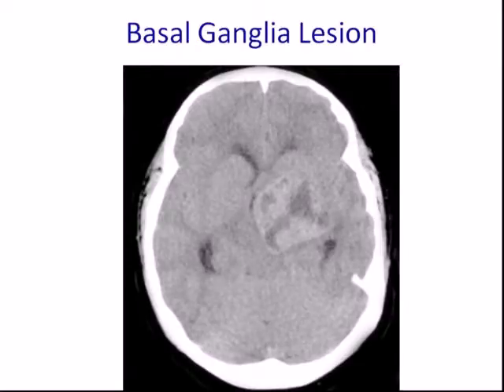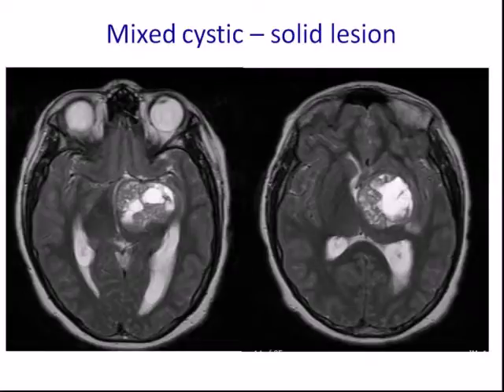This is another case. I am still in the sort of germ cell tumor abnormality spectra, just to give you a hint. This actually came in concerned that this was a pilocytic astrocytoma. But if you look at the lesion, the solid area is hyperdense. It's not hypodense. So that would be a little atypical for a pilocytic. And then on the imaging, you can see some fluid levels in the cysts. It's very well circumscribed. It doesn't have a lot of edema around it.